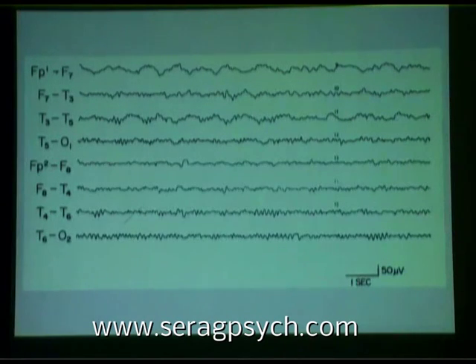And then at the end of the seizure, you see the right temporal lobe really almost normal there, whereas the left temporal lobe here has this delta activity. Now, Masako Kaibara and myself studied the postictal EEG, and we found, to our astonishment, that way over 95% of the time, the postictal EEG localized the onset of the seizure.